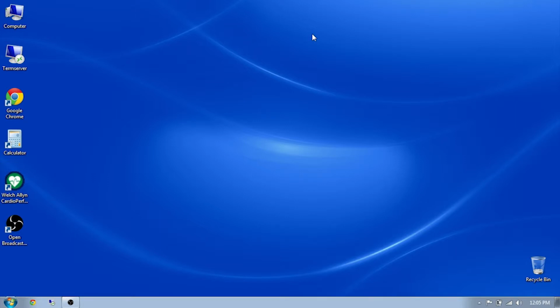Today we're going to be doing a brief tutorial on how to transfer your EKG and spirometry documents electronically to our EHR system. Step 1, you're going to select the Welch-Allyn Cardio Perfect icon on your desktop.